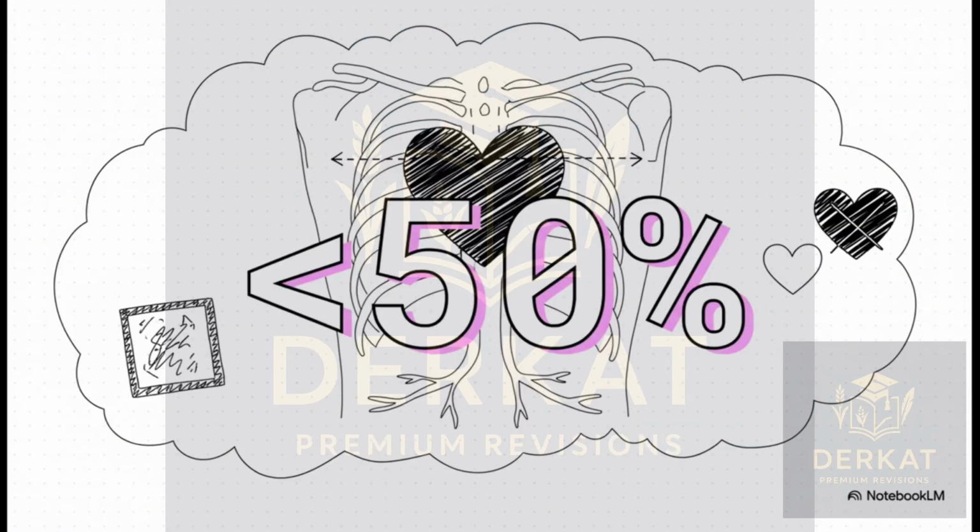Next up is C for circulation, and we start with the size of the heart. The key rule to remember here is the cardiothoracic ratio. On a good PA film, the widest part of the heart should be less than 50%, or less than half, of the total width of the chest. If it's bigger than that, that's a sign of cardiomegaly, or an enlarged heart.